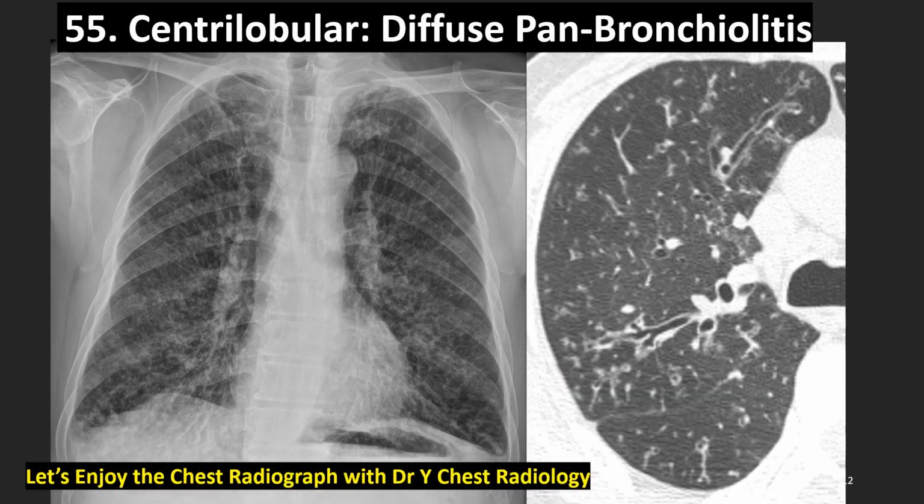Now let's start our journey of museum travel. The museum name is Museum of Pointillism. The first one is centrilobular. The name of the disease is diffuse panbronchiolitis.